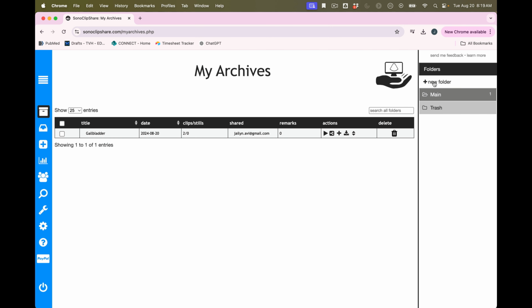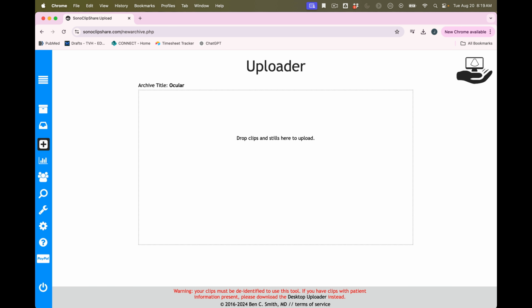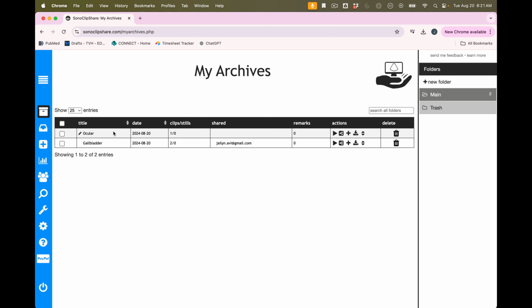Now let's talk about adding another archive. We could create a different one for ocular, and let's upload a papilledema clip here. Kind of a big clip there, but we're going to let it upload. And we can go back to the archive and see that now we have an ocular one here.